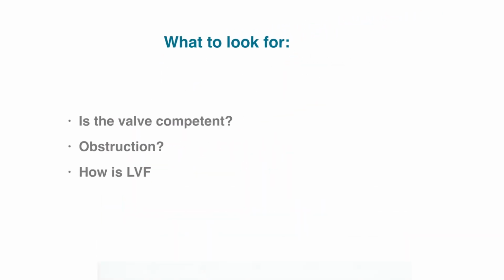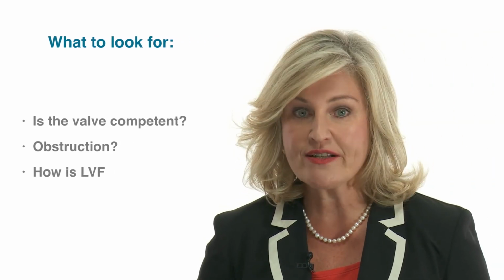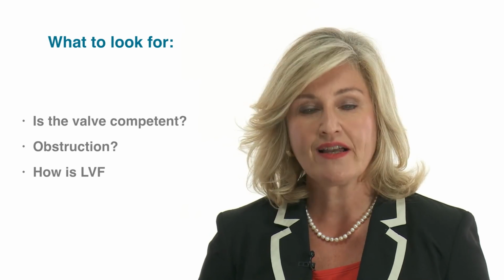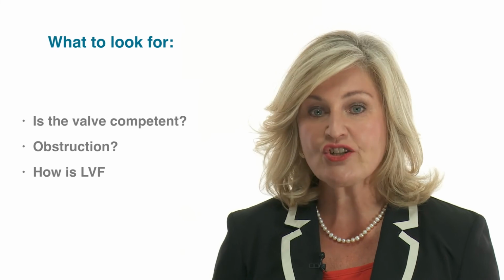And what are the things you should look for in patients who have annuloplasty rings and repair? Well, first of all, we have to look: is the mitral valve still competent? Do we have mitral regurgitation again? And also the mitral annuloplasty ring can cause obstruction and stenosis. And finally, we have to consider the left ventricular function.